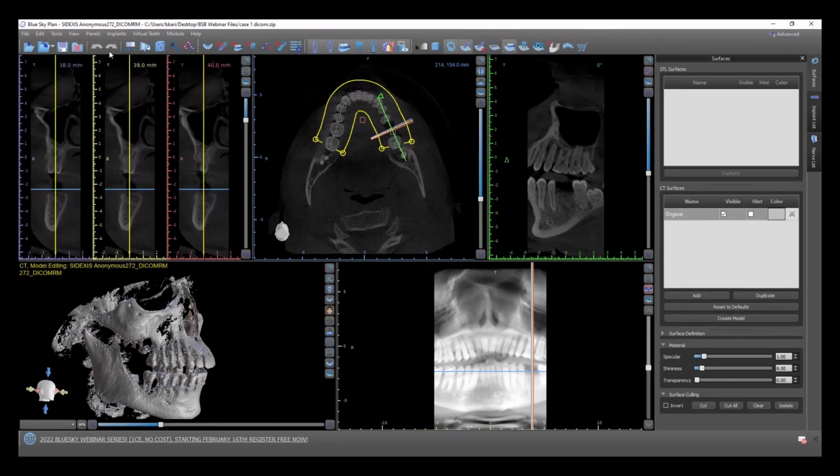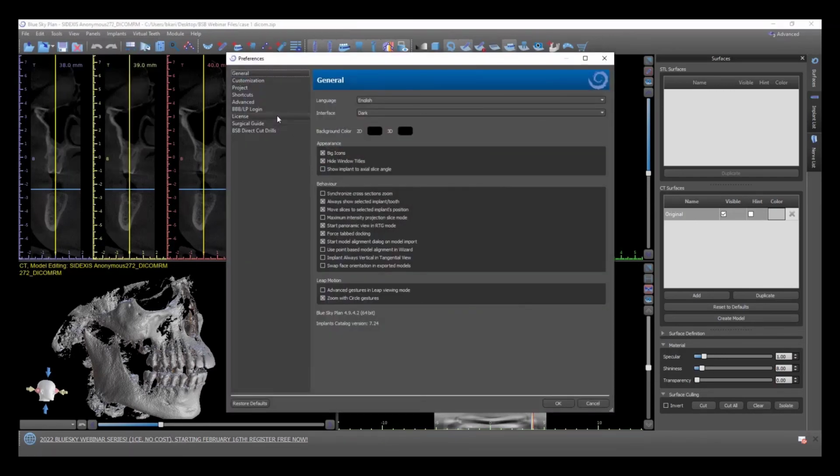So again, just one other general navigation piece of information that I found to be helpful at certain times. So hope that's helpful, and we'll move on to the next thing.